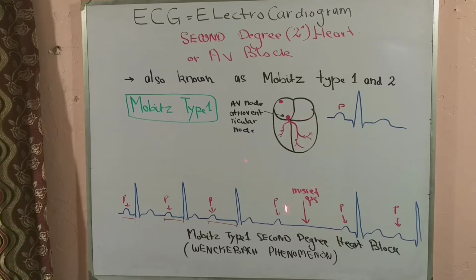So that shows us the disappearance of the QRS complexes, but it is flanked by two P waves, because the P wave had happened as a result of the impulse coming from the SA node, not from anywhere else. So the atria did respond to the next 2 or 3 impulses coming from the SA node, and they generated the P waves. But yes, that impulse has been denied entry through the AV node going all the way down to the ventricle.